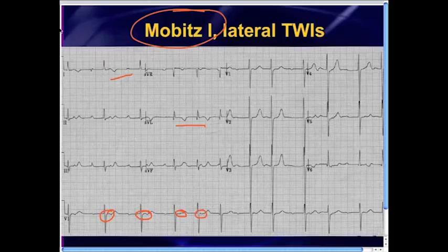You know, those are not clear-cut P waves. You just map it out with what you know for sure is a real P wave. I know that's a real P wave, and that looks like a real good P wave. So just map it out. And what you find is that sure enough, they do map out very nicely. That means that all of those are true P waves.